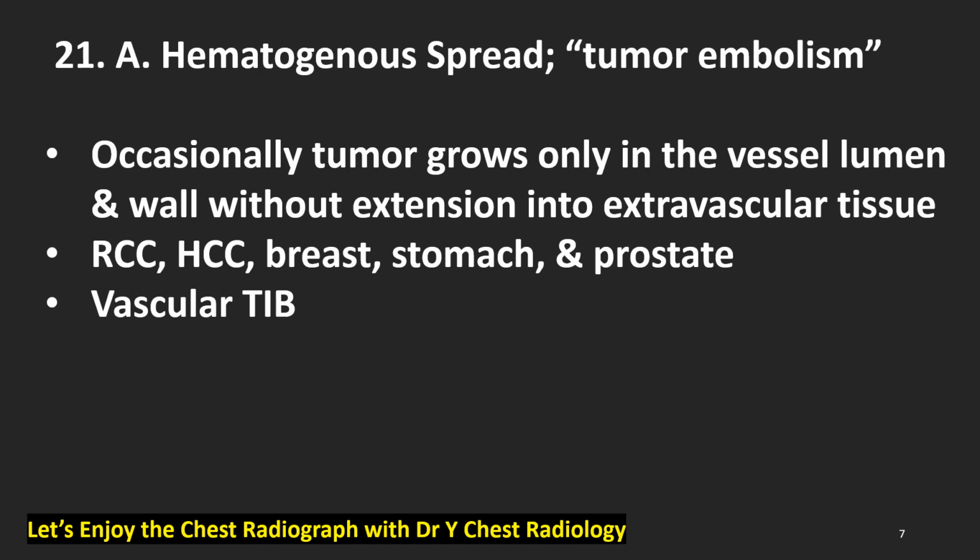We sometimes call them vascular tree-in-bud because it is not the famous airway tree-in-bud of tuberculosis, but it's in the pulmonary arterial tree, so we call it vascular tree-in-bud.